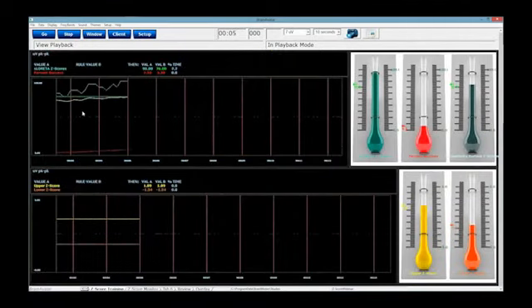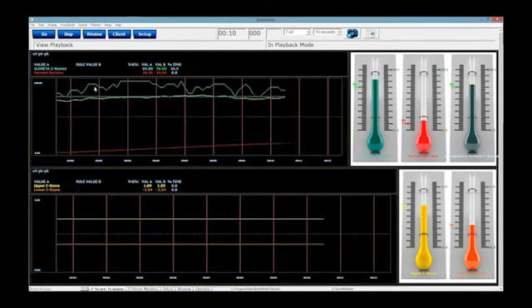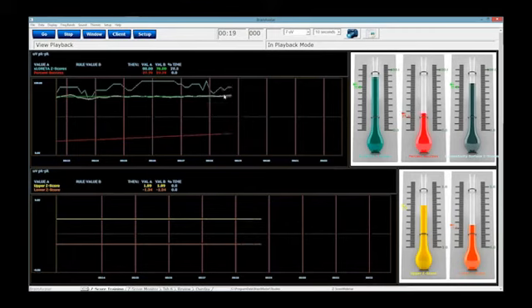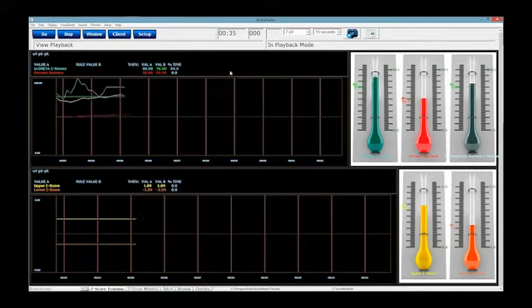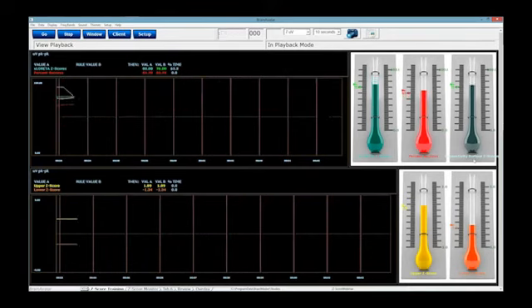All right, now you're going to notice there are 2 additional lines in here. This one right here is our ZScore one. This is our Surface ZScore one, kind of going up and down right here. And the lighter blue one right here, or no, I'm sorry, my apologies, the turquoise one right here is our sLORETA ZScores. So that's the one that's a little jumpy, and it's a little jumpy because we have 25 total ZScores. So of course there's going to be a little bit more play. And then you got this nice smoother one, which is a lighter color, kind of like a light blue. That is our connectivity Surface ZScores.